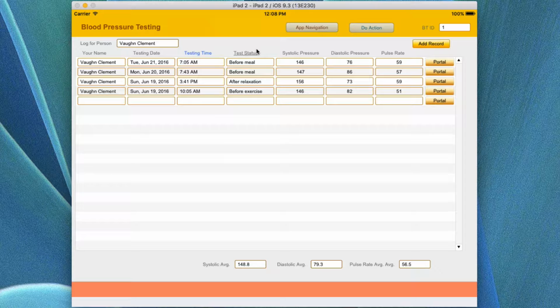Now, in order to start a new record, you would click on Add Record. And in this case, you would put in your name. You can put this in there any way you want to. You can put the name, and maybe May, June, July, August, whatever it is, or you can do a 6-month or a year. It doesn't make any difference, but you would collect the data for that period of time that you're actually adding data in here. So for example, we're in the month of June.